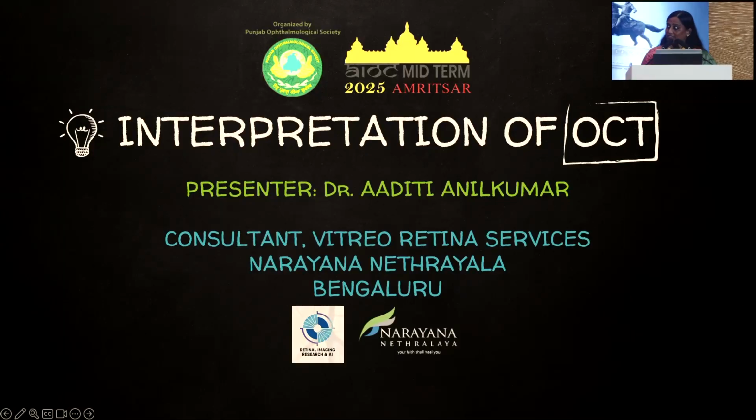So it's a very basic talk to look at some of the most common things one sees in the OPD. It's not just for the retina people, because we day in and day out see OCTs. It's also for anterior segment surgeons, because it can help you prognosticate better.